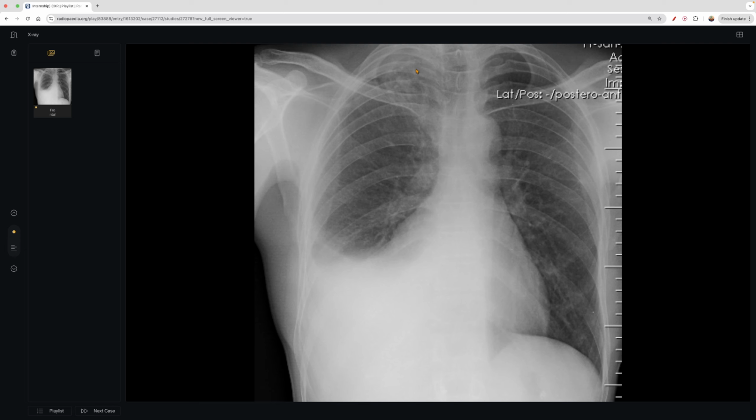And then we come up here, so let's do the whole lung. We see there's a little opacification here. I'm not too sure if it's going to be relevant. And then we come back down and we go from the trachea. Otherwise, you can see how this pleural effusion is actually obliterating the right heart border, right? So again, it's another way to silhouette because you're losing that air. And the silhouette sign typically is reserved for pneumonia, I like to think. But at the end of the day, you can at least see and appreciate that concept a little better here.